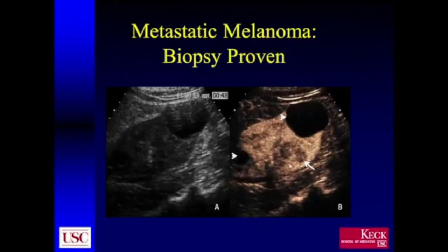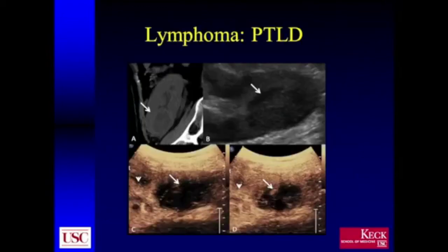ultrasound that confirmed that there was this relatively small hypovascular mass in the lower pole of this kidney. This was eventually biopsied under ultrasound guidance and did turn out to be metastatic melanoma. Again, nothing specific. Given the location, this could certainly represent a papillary renal cell or even a transitional cell. Again, given the history, however, of melanoma, metastatic disease would certainly be a consideration.